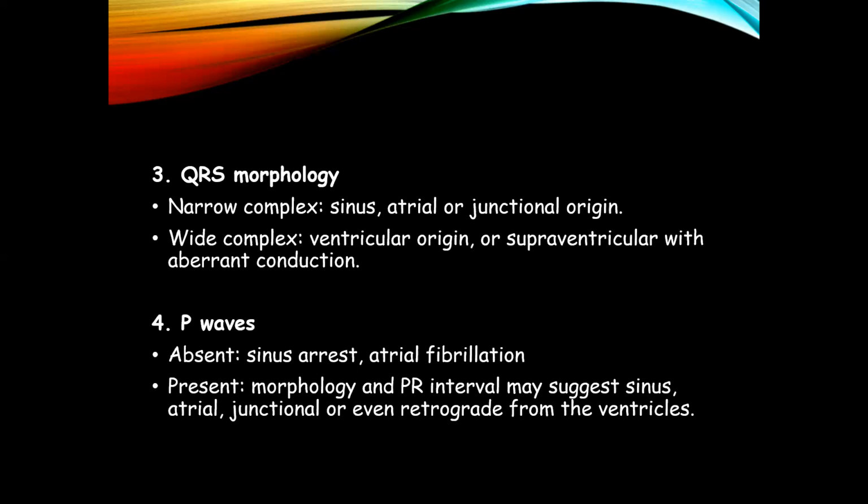Then we look at the QRS morphology. Is it narrow complex or wide complex? Narrow complex is whereby you think of sinus, atrial, or junctional origin, and wide complex you think of ventricular origin or supraventricular with aberrant conduction.